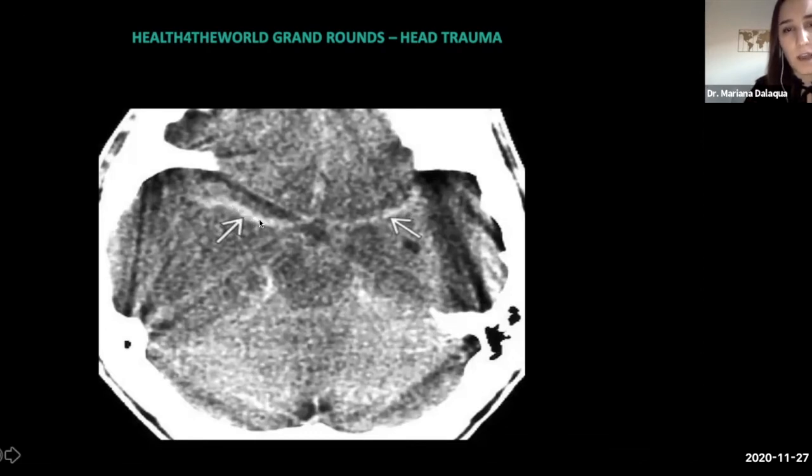They're not hyperdense, they are normal, but they seem hyperdense because the parenchyma that is adjacent is abnormal. So in fact, this is a case of pseudo subarachnoid hemorrhage that should not be mistaken for a true bleeding, okay? This is a pitfall.